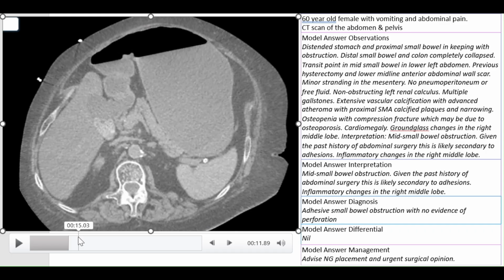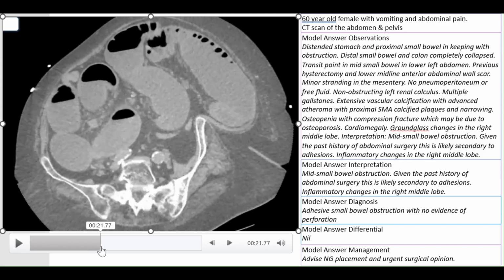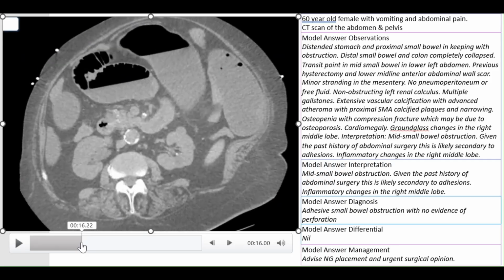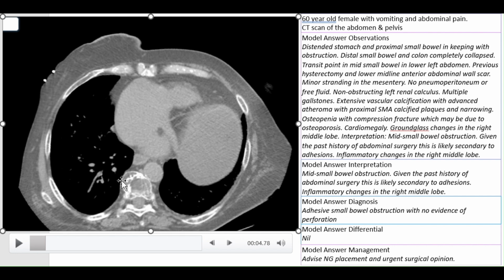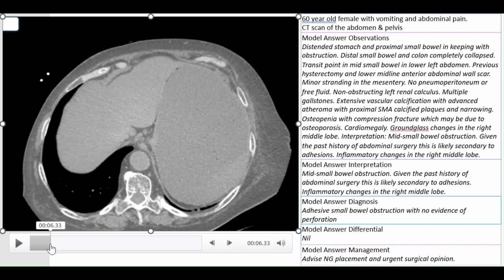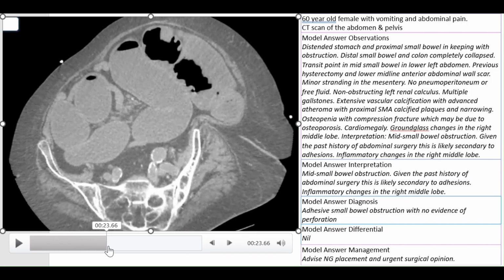No fractures here. So the compression fractures are seen in the lower thoracic vertebrae, maybe due to osteoporosis.